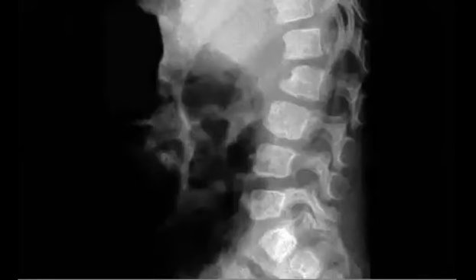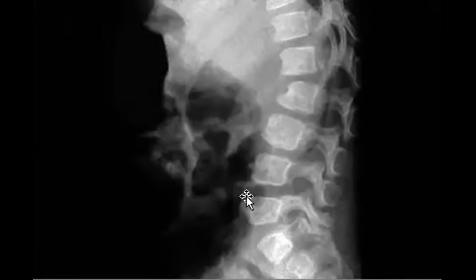One of the good issues we mentioned last time, some syndromes. So try to describe the spine here. Anything give you a clue what it could be? Yes, when we find beaking, it could be Hurler. This one is not midline, so it is maybe Hurler type.